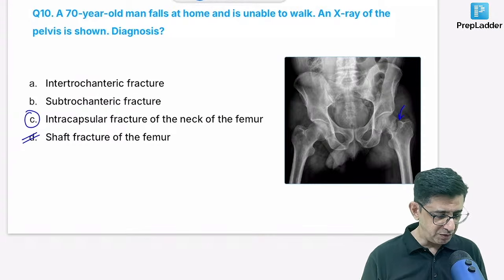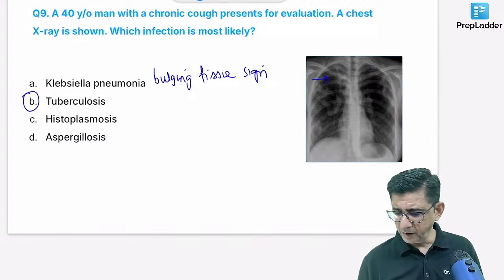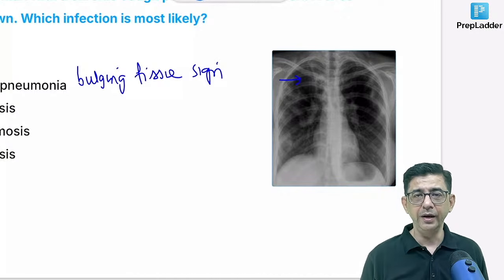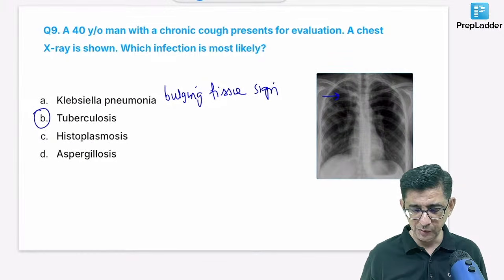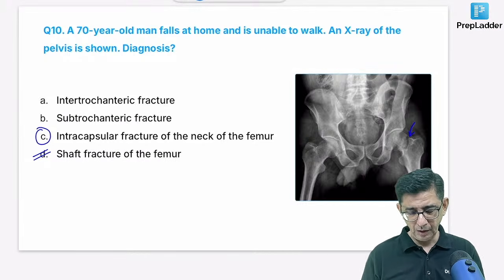So quick answers with respect to... not exactly, man. When I say lymphadenopathy, I'll have to go for a common answer, right? That's going to be the mediastinal adenopathy that is present. I'll think in terms of a more common lesion in the upper lobe. Then I'll think in terms of tuberculosis as compared to histoplasmosis. There has to be some kind of immunodeficiency given in the question for me to think in terms of histoplasma.